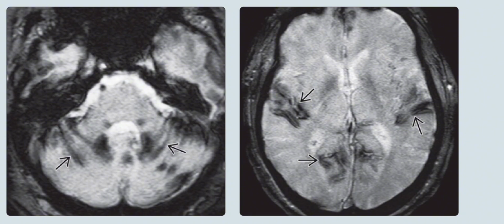Right is the more cephalad scan in the same patient, and it shows prominent superficial siderosis along the sylvian fissures and the medial occipital lobes.